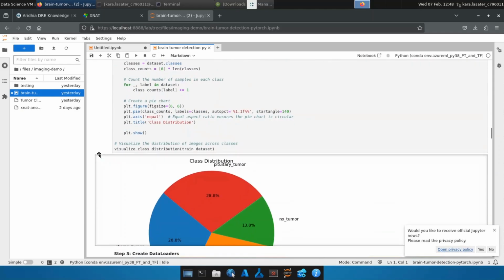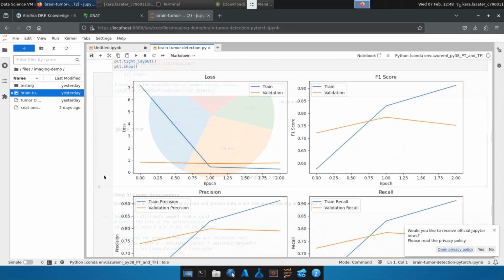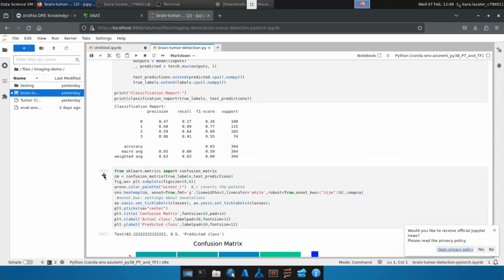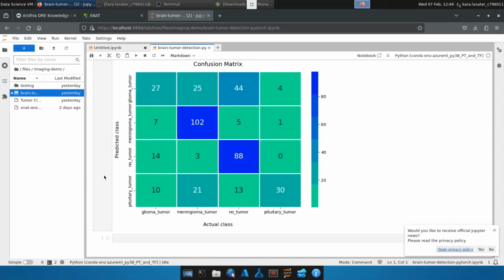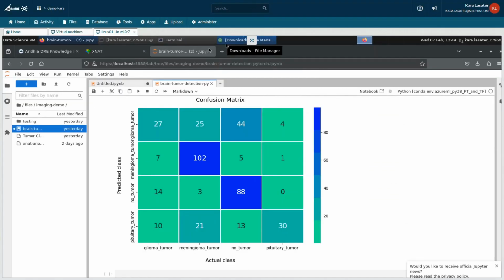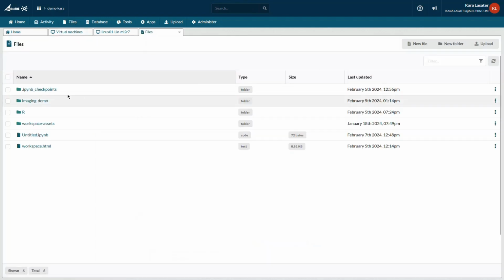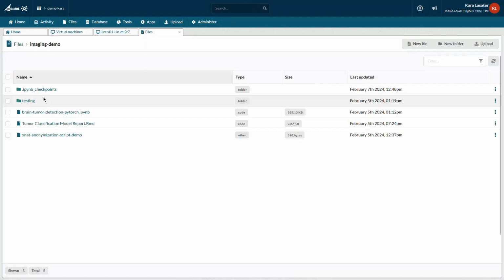Since my workspace has private access to a service called Git for version control, I can version and develop my code with team members to track changes over time. This helps preserve our team's project history and ensure reproducibility and scientific validity for the model we developed.